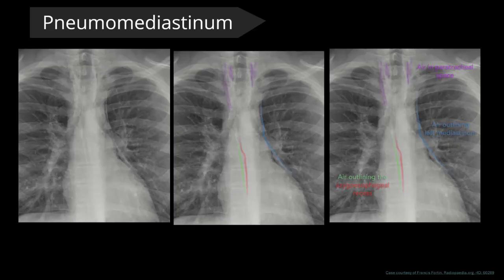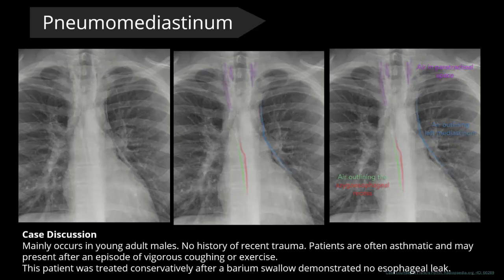It's a good example of air in the azygous esophageal recess, which normally is a white stripe, not dark with air. Here's a little information from the case discussion regarding this occurrence in young persons with excessive or severe coughing.